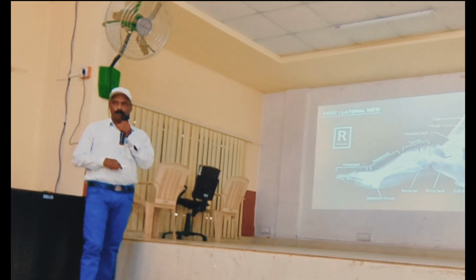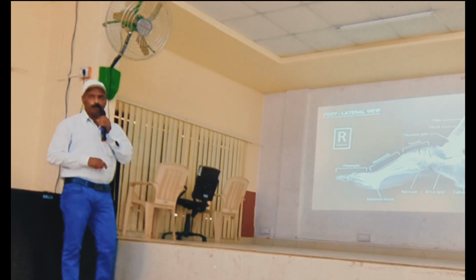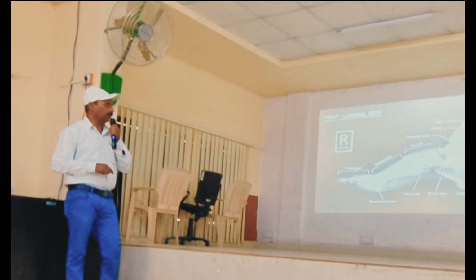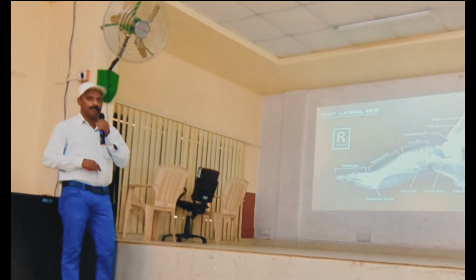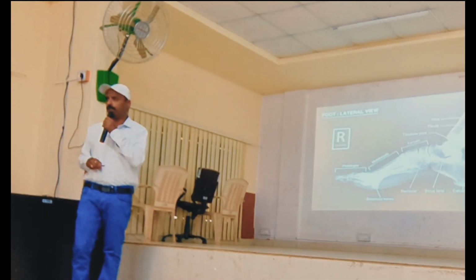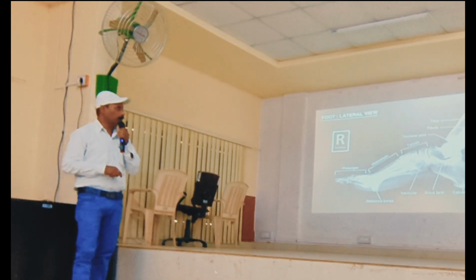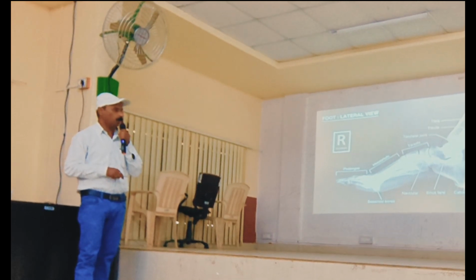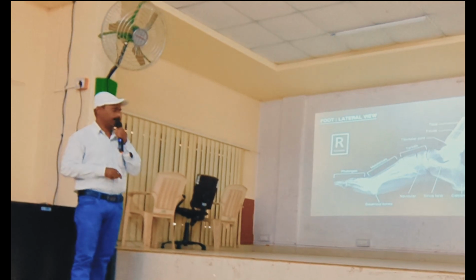Foot region, lateral view, plain X-ray. Here we see the 7 tarsal bones, 5 metatarsals, 14 phalanges and the calcaneus. A common complaint in applied anatomy is heel pain, due to growth of the bone or other causes, so you have to see the normal calcaneus to identify it.